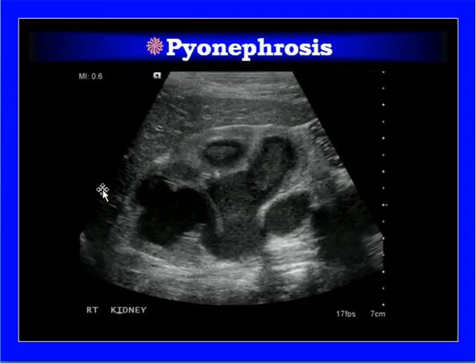Now this is pyonephrosis, when there is long-standing hydronephrosis due to any kind of obstruction. There is infection in the pelvic calyceal system due to the stasis of the urine along with a lot of bacteria, and that can lead to pyonephrosis. As you can see, the dilated urinary system is showing a slightly gray density indicative of particulate material, and this is an ultrasound picture.